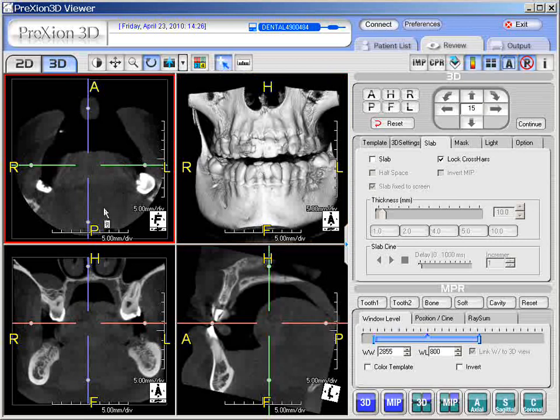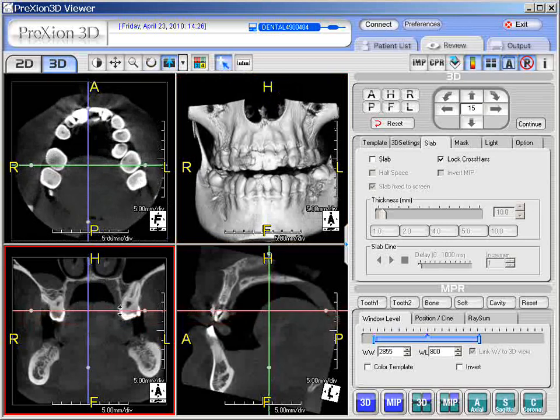First of all, let's talk about what these densities mean. Now, with typical traditional CT images, a Hounsfield unit is a unit of density. With cone beam scanning, the Hounsfield unit is very, very similar to the Hounsfield unit with the fan-shaped CT images that are created with industrial hospital-grade CT scanners.